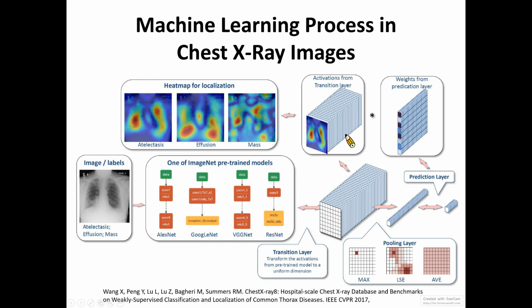If you change these dimensions, it will affect the resulting configuration in the following layers. So it's better that we just resize our input images, but not change the parameters in the neural network, if you want to use transfer learning. Here MATLAB gives you a simple explanation that if you want to resize the images, it has a very simple function for you to do this.